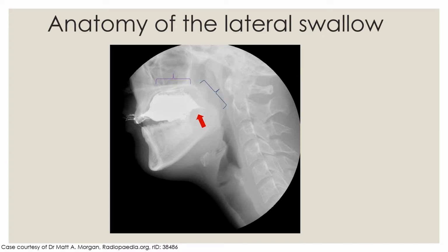So we have normal anatomical structures here. First of all, as I mentioned previously, all high density structures such as bone appear white as they block X-rays from being detected by the detector. And so we have the mandible, we have the maxilla, we have the cervical spine, so we have C2 here, which is the dens. We have C1 here, and then C3, 4, 5, 6, and so forth.